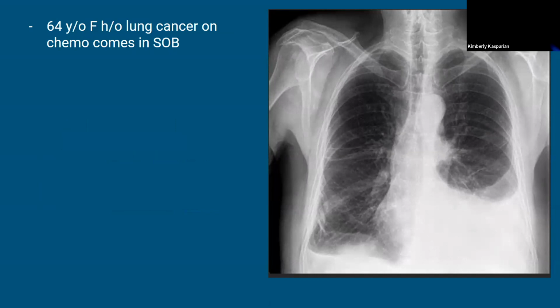We're good. Okay, 64-year-old female, lung cancer, just got some chemo. Now she comes in short of breath and onc is capped. And of course, hospital is accepting.